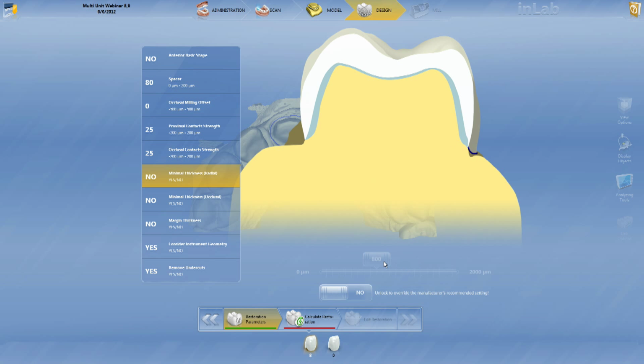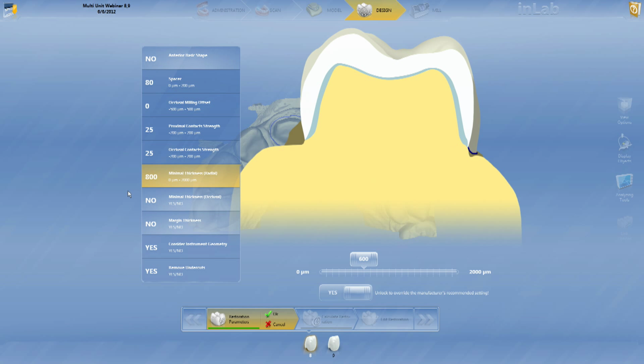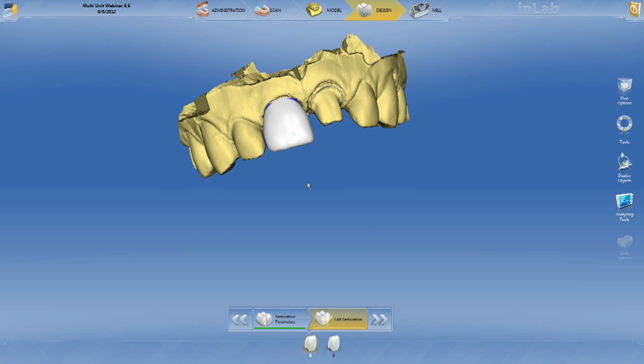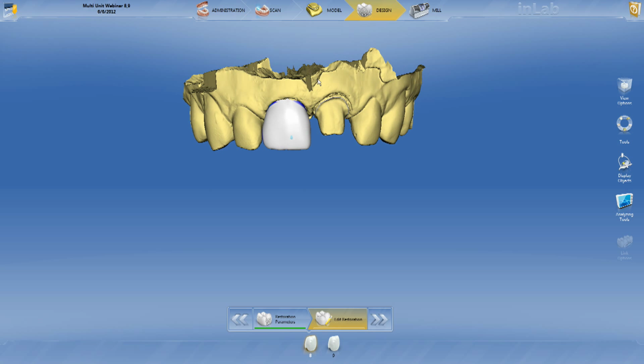Again, we just want to go through this really quick. Let's just do that 600. I know a lot of you are thinking, oh my god, parameters. But I want to just move forward here and propose this one. Okay. Of course, it's a little short. Okay.